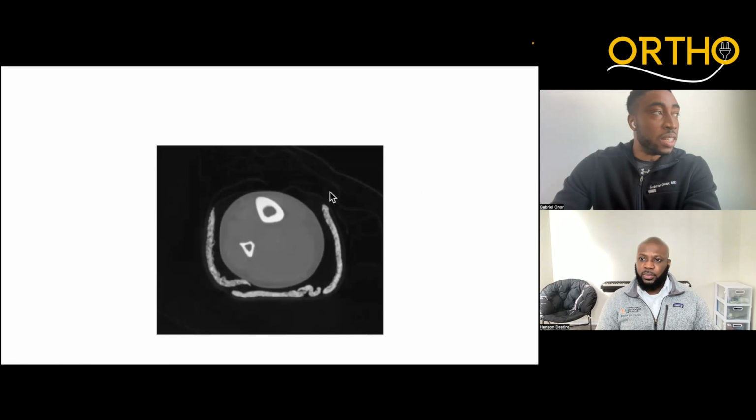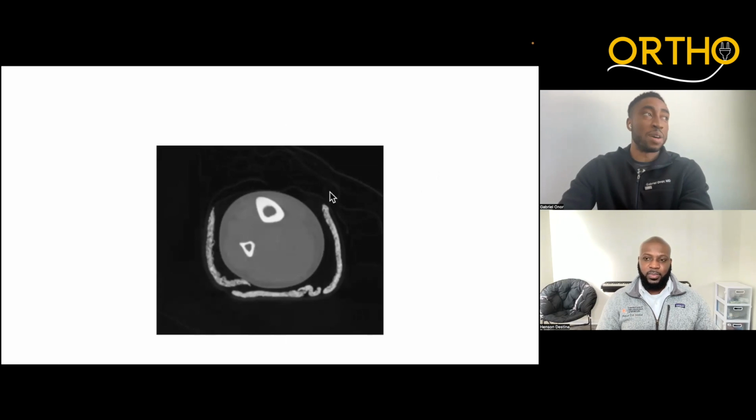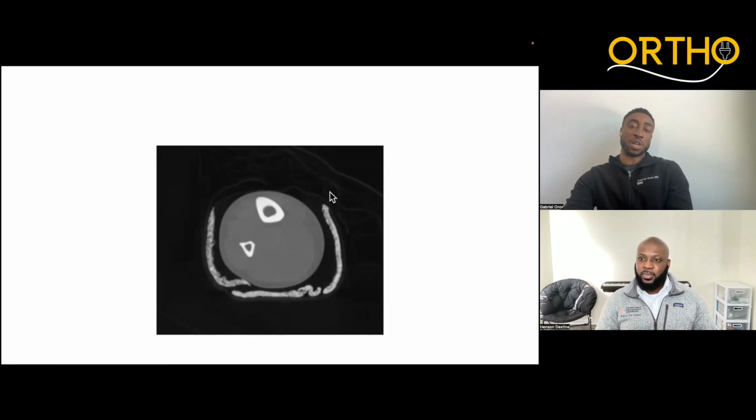we often, or probably 99.9% of the time, treat this, if the patient's going to the operating room, with an intramedullary nail. The reason we would get the CT is to identify, hey, are we going to put a screw into the posterior malleolus?